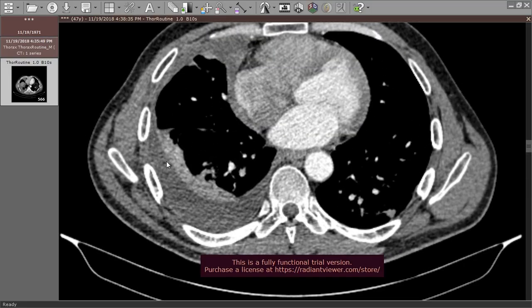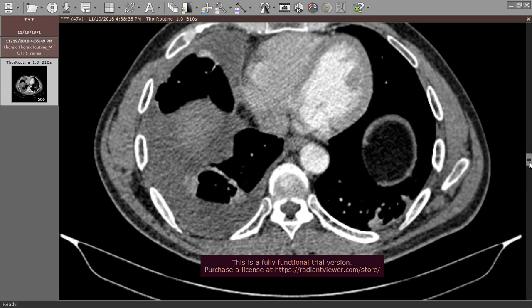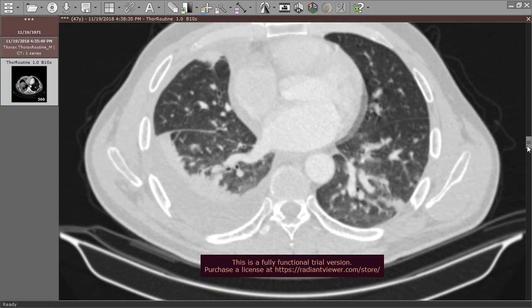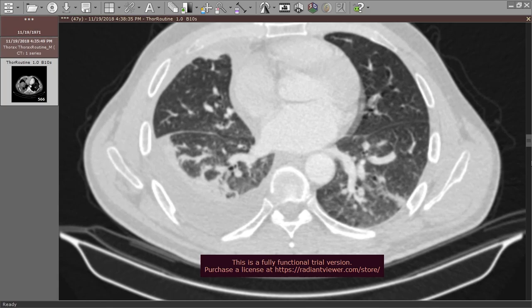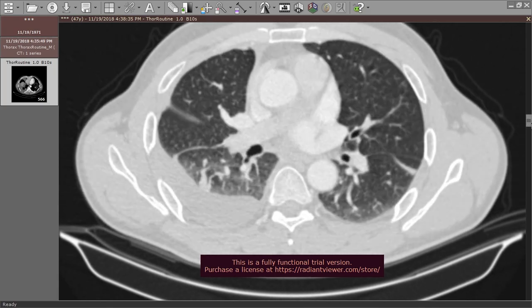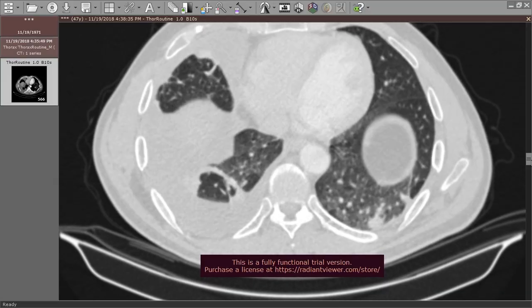This part of the lung is draped over its surface, posterior dependent. This is what's called relaxation or passive atelectasis of the posterior segmental zones of the lung. And we also have these atelectatic plates or atelectatic bands, sequel to previous infection, sequel to previous insults, or sequel to previous resolved effusion.